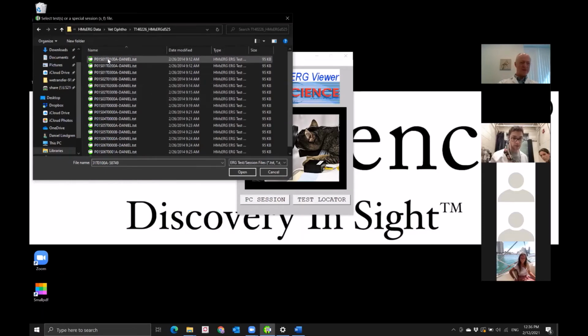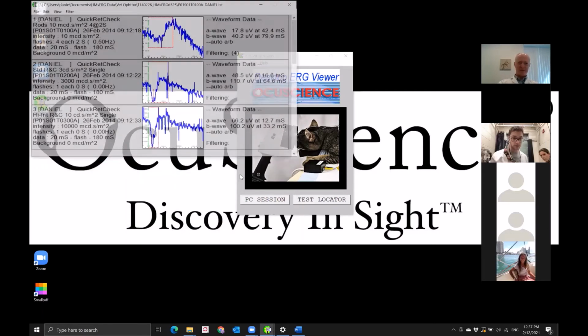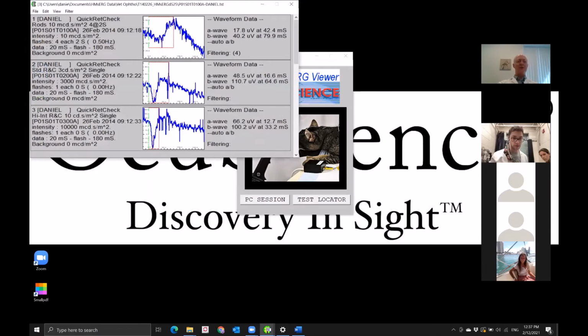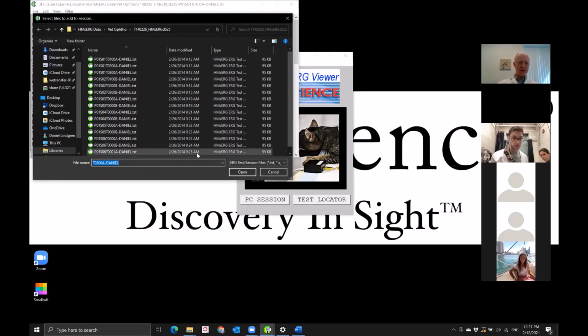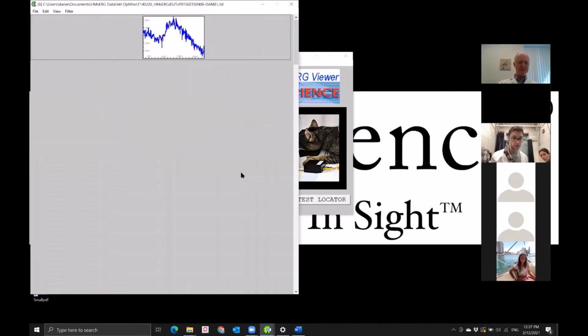All right, let's see if I take. All right, a little bit of noisy data. Now this is a quick recheck test, and here is one set that was done. Let's see, I may not have a separation in date here. Let me see if I can add to this session, and let me come down here and scroll down. Yeah, I think I'm going to only have one date set here.